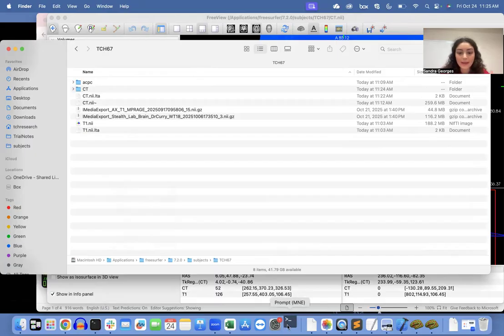We're going to type in a couple of things from our script into the MNE Python terminal, and that will be the last step. So wait for that to open up.